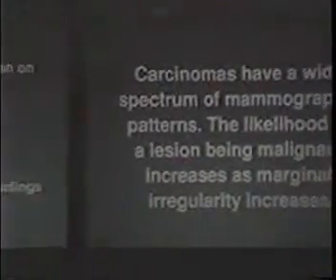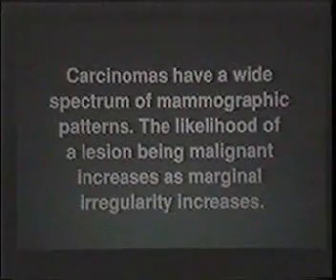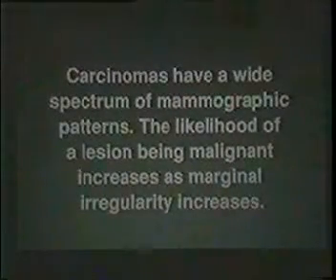Carcinomas have a very wide spectrum of mammographic patterns. It is very important to always remember that the likelihood of a lesion being malignant increases as the marginal irregularity increases.